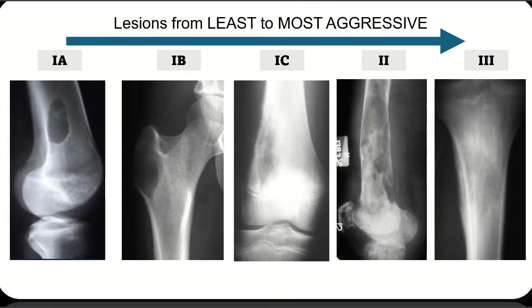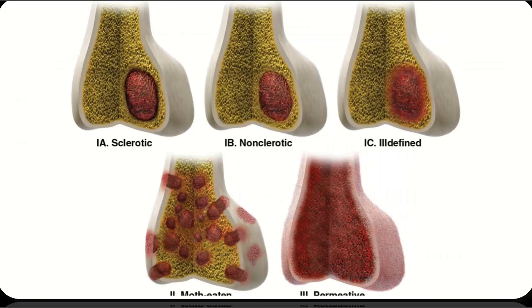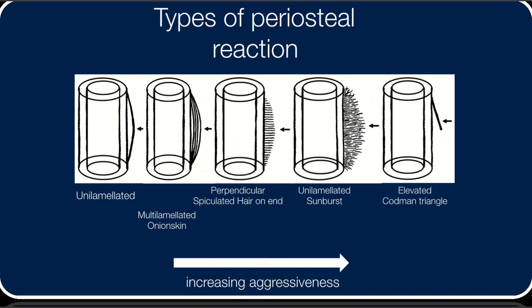We can see actual patient image examples from each of these types of lesions. On the right, type 2, moth-eaten appearance of multiple myeloma, hard to see where it starts or ends. The type 3 is a Ewing sarcoma, ill-defined, diffuse, it's very aggressive. Here's another nicer image to show the nature of the lesions within bone.